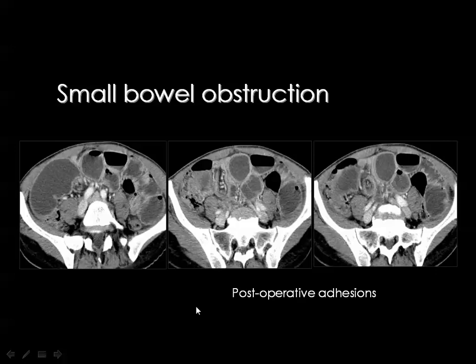In patients who had the CT examination, you can also see the same findings, and here the small bowel loops are markedly dilated, distended with fluid, and you can appreciate some air fluid levels in the dilated intestinal loops.